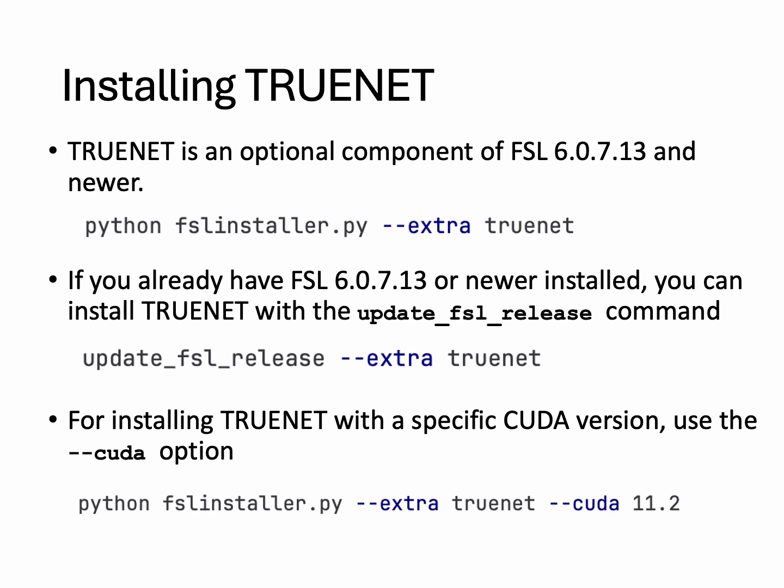The detailed instructions are provided on the FSL page, so please visit there for more instructions. I'm just going to give you an overview of installation here. You use the Python FSL installer, and you add an extra flag, and you just mention TrUE-Net, so that would install TrUE-Net as an additional component module to FSL.